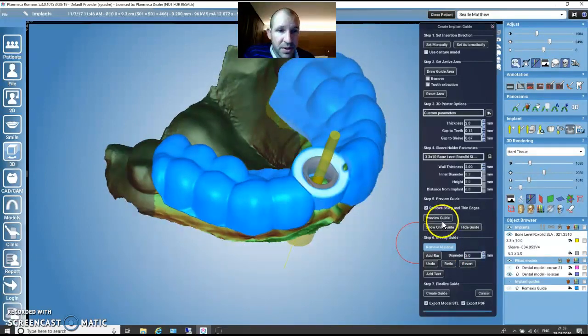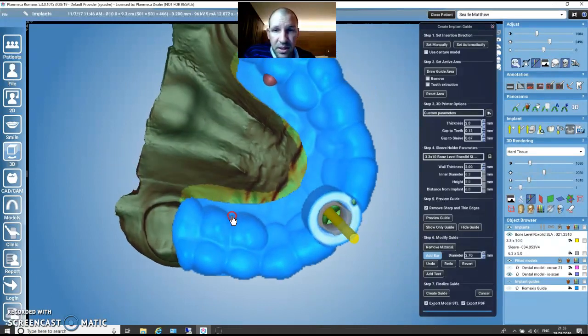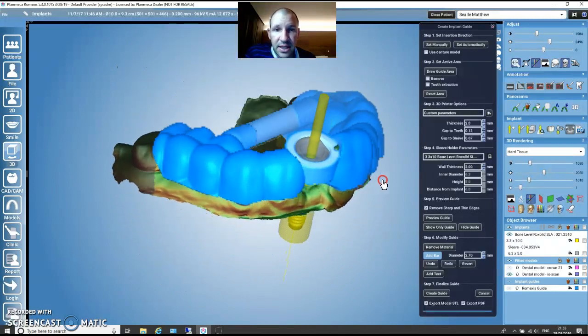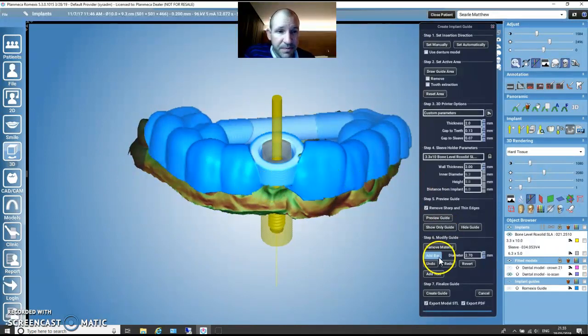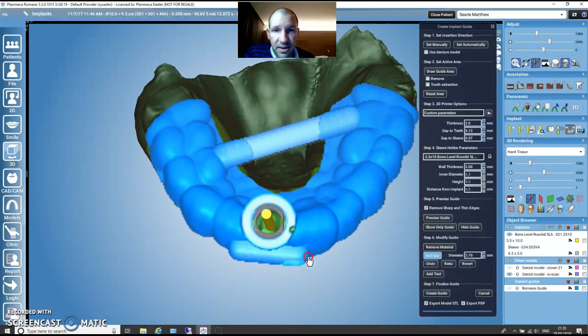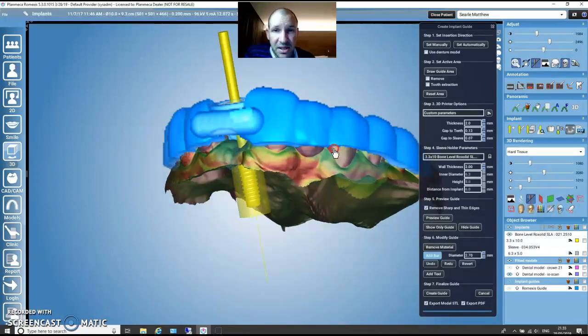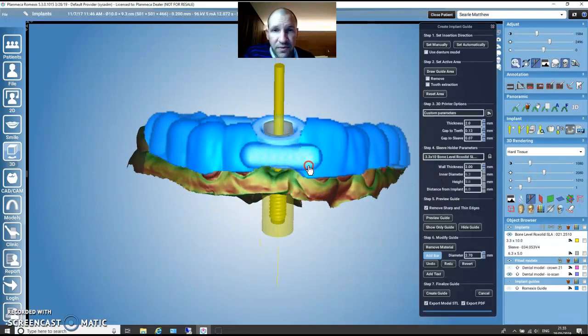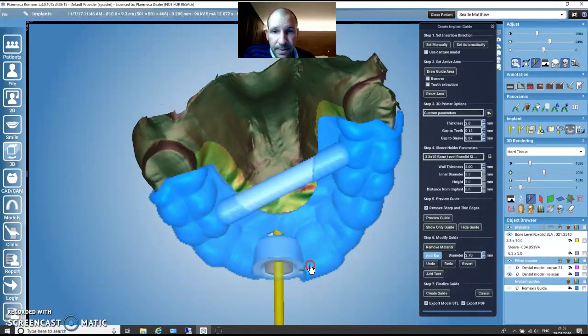Now the next step, if you wanted to, you can go add bar. Let's make it a little bit thicker, and you can click on, say, this point, and rotate it around, and we want to click on this point. There you go, bar created. Nice and easy. If you wanted to add another one on here, you can then click on here and here. Give yourself a little bit of retraction so you can keep the lip out of the road on this particular case. You can delete material in there as well. Make sure you've got enough room for water.